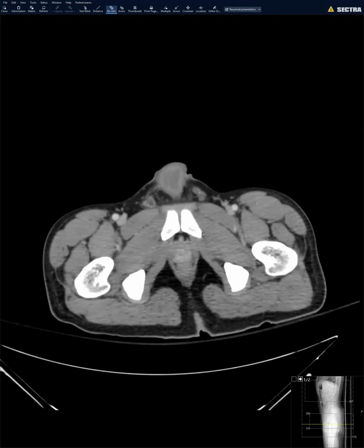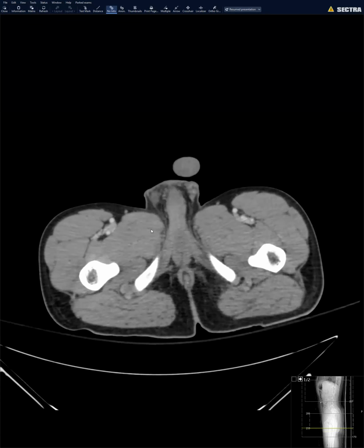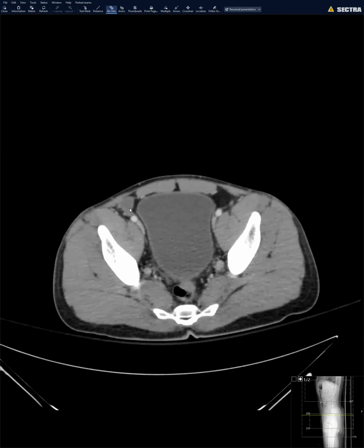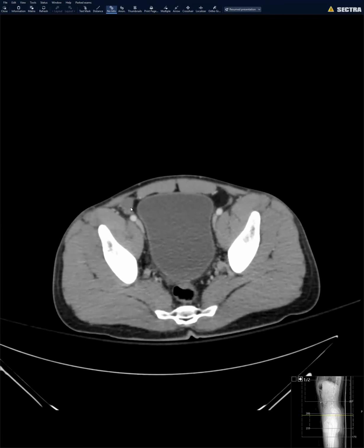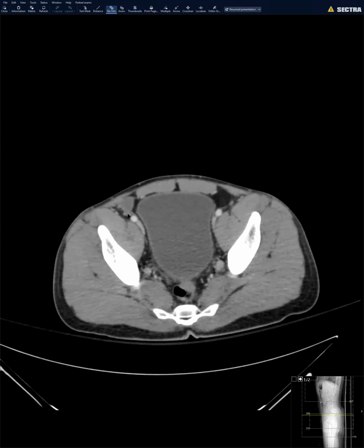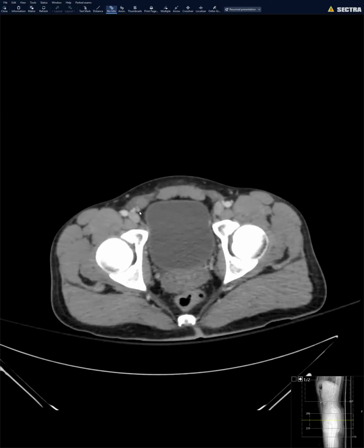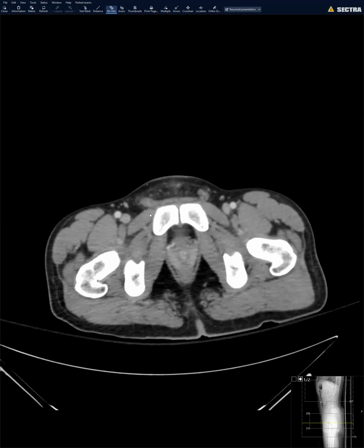Did he only have one testicle in his scrotum? Right. So what they reduced was his other testicle, right? That's the one high riding here up above the inguinal ligament. So I think they mistakenly thought this was a loop of bowel, and because it's so rich in nerves, they triggered a good vasovagal response and he bradyed.